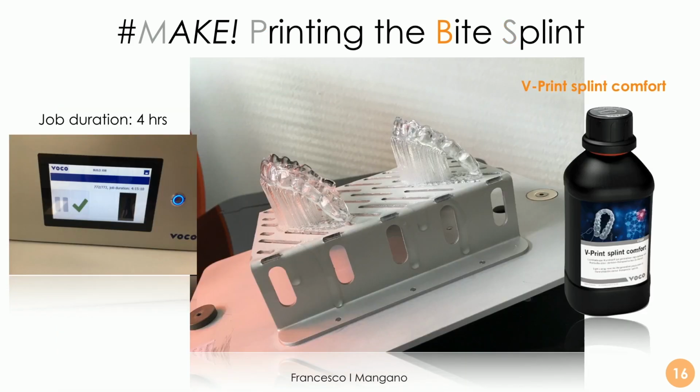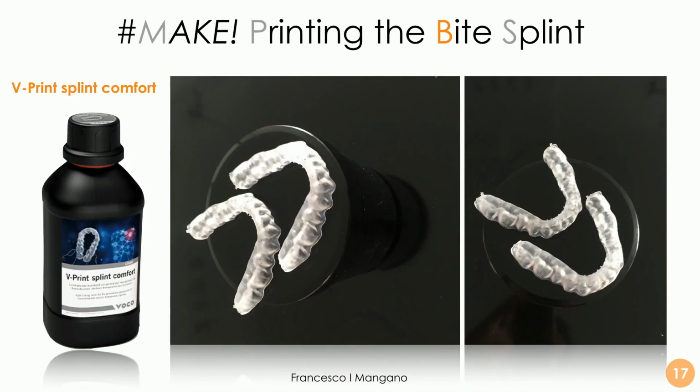This is the printing plate, in this case two identical copies, printed with the V-Print Splint Comfort material, which is absolutely the material for the case. A job like this can take approximately 3 to 4 hours of printing, but it's very accurate. And then we can of course see the two identical copies of the bite.